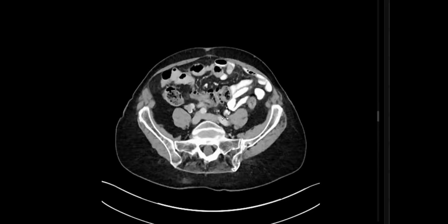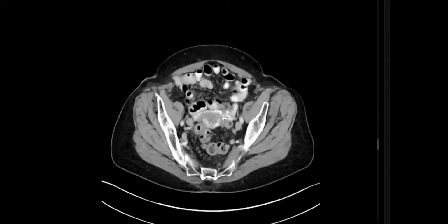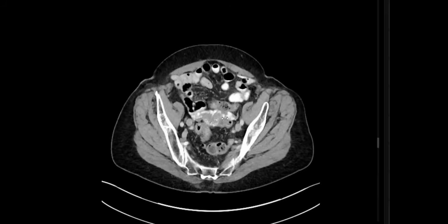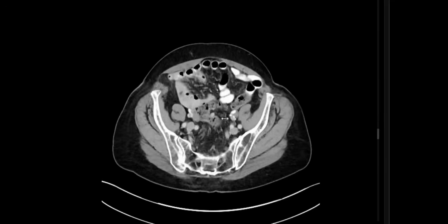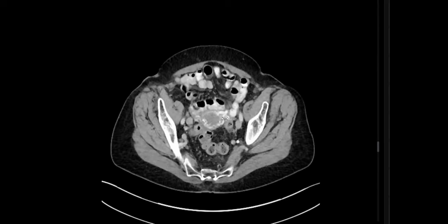And show me the uterus down. Are these vessels normal or engorged? Subserosal vessels are significantly enlarged and hyper-enhancing. So what's the diagnosis? Pelvic congestion syndrome. This is the cause of bleeding and pain, recurrent pain and bleeding in the absence of fever. This is a very common and commonly missed cause. In such a condition, thank you, my friend.